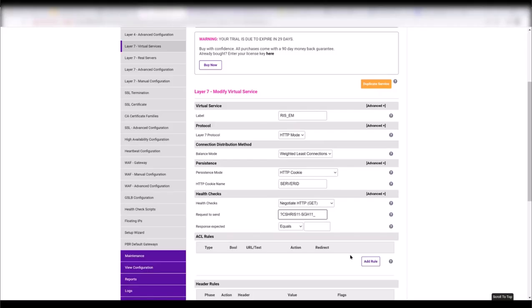So this is basically your environment name, from all I understand. And then the rest of it is common in all the deployments. And API. Trying not to make any typos in there. And then it's health check again.